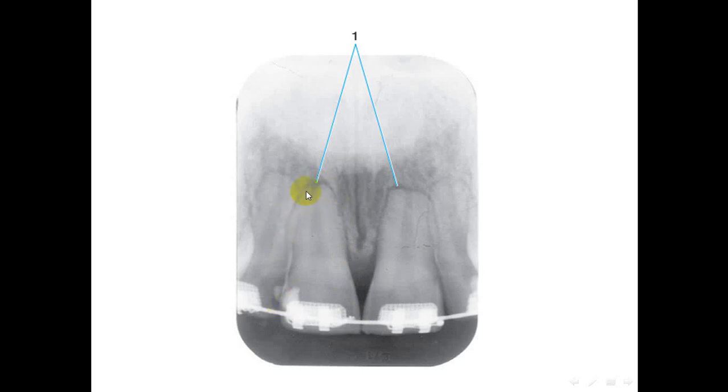All that exerts an abnormal force on the tooth, forming an external resorption. You see that there is no apex, with loss of one third of the tooth. Of course, it is seen in the lateral, central, and lateral incisors, and this is all external resorption. This external resorption is caused by the application of trauma during orthodontic treatment.